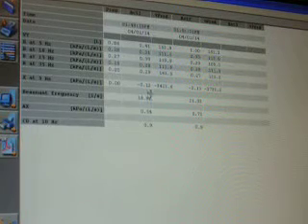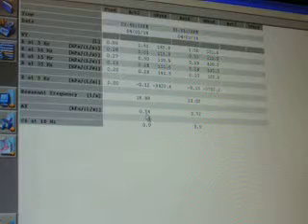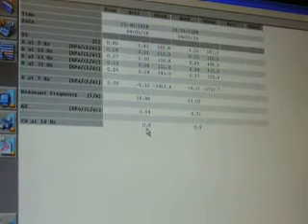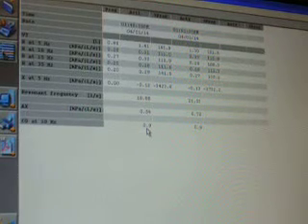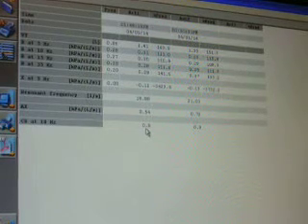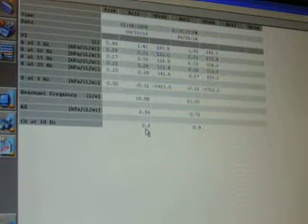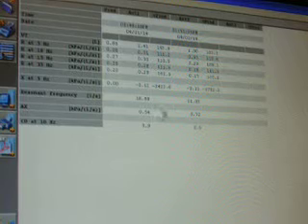So if we look at this, X at 5 Hertz is negative, that's good. We have a value at AX, that's appropriate. And our CO at 10 Hertz is 0.8 or above, it's 0.9. So according to the values, this is an acceptable maneuver. We already looked at the breathing pattern when we edited it. We knew that was a good breathing pattern, consistent, everything looked good, so this is an appropriate maneuver.